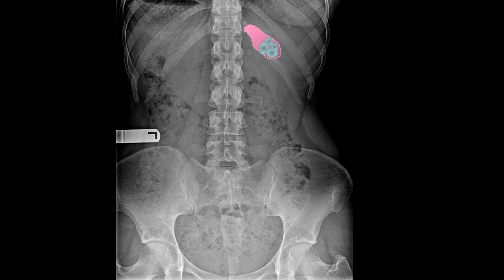And when these do occur, or if there's abdominal symptoms or complications, there'll be a cholecystectomy, which is where the gallbladder is cut out and removed, and then what will be left is the visualization of 1, maybe 2 or 3 vascular clips. And when you see vascular clips in this right upper quadrant, that's typically indicative of a previous cholecystectomy.